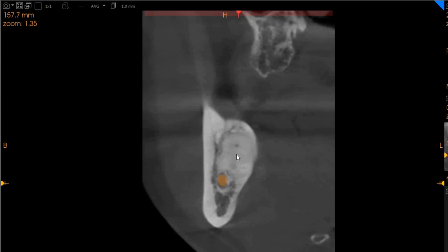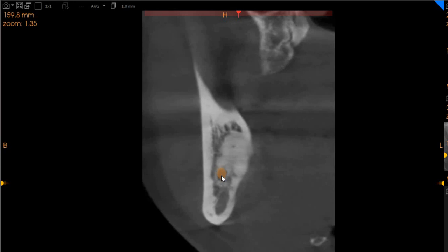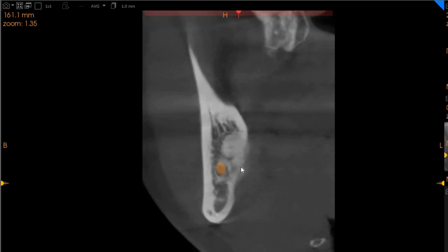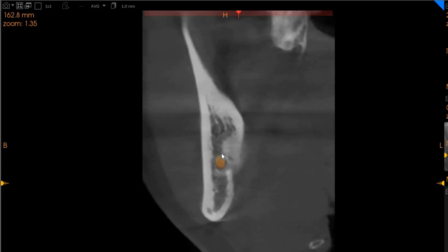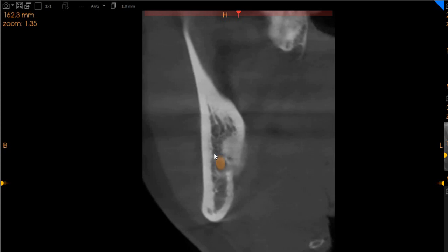Again, very ankylosed tooth. You can again see that there is a radiopaque bone or osteosclerosis between the two roots as well. And also you can see that the mid root level now compresses the inferior alveolar nerve on the left hand side as well. And here also you can see that both the roots are very closely associated with the inferior alveolar nerve.